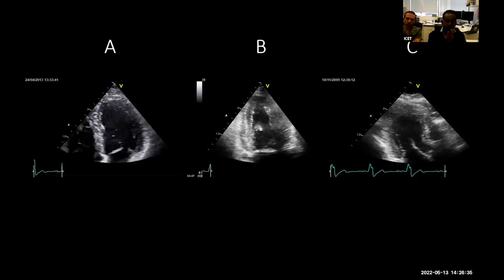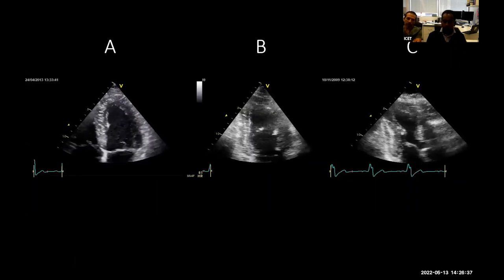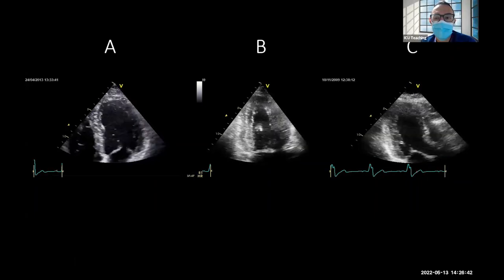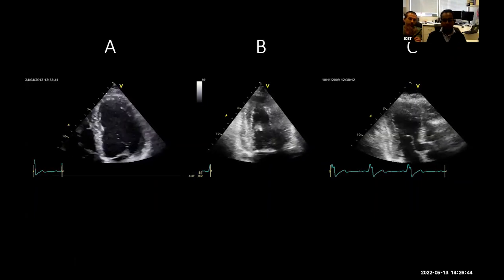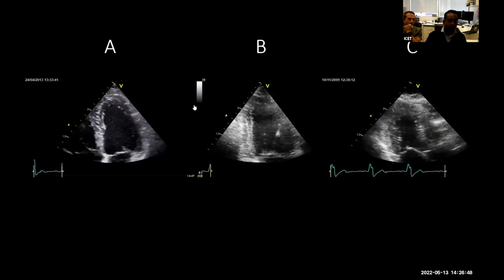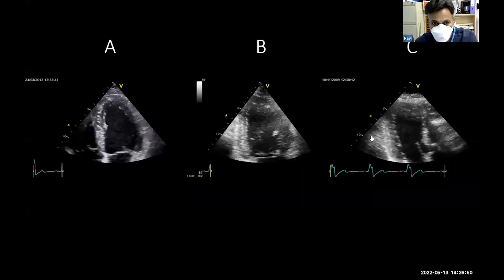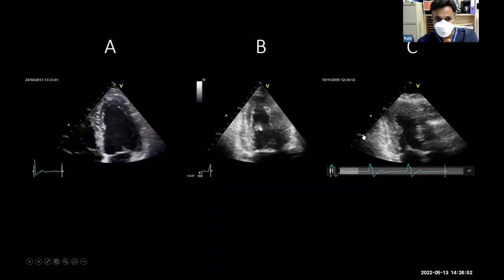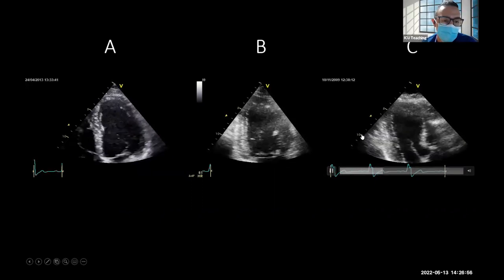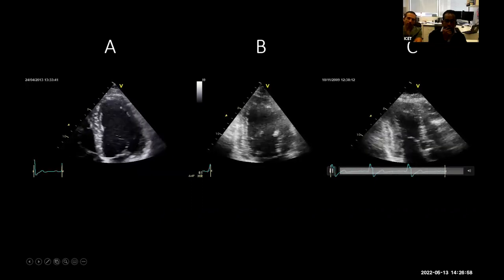What about B? So I think that the software was okay. So yes. Someone was going to say something on that. Yeah, some of the anterior and posterior wall near the apex is not completely captured. So what would you do in that case?